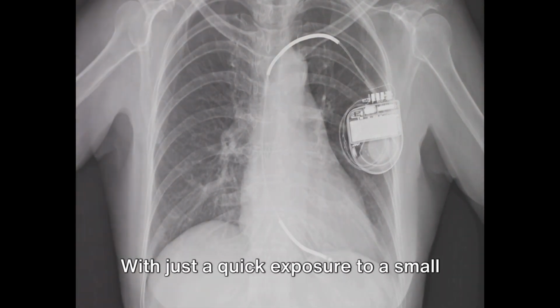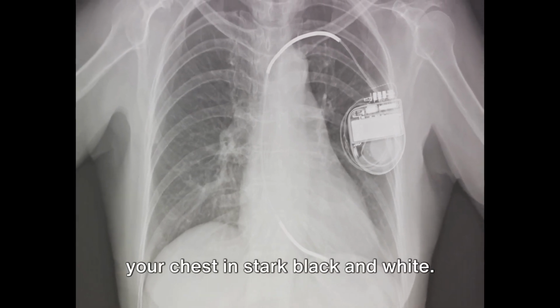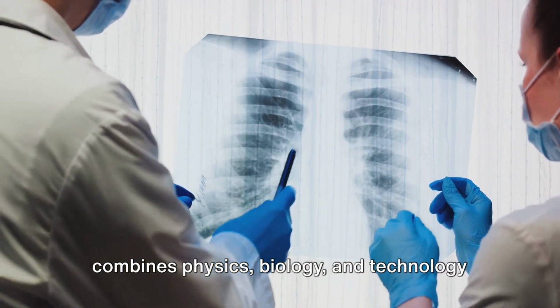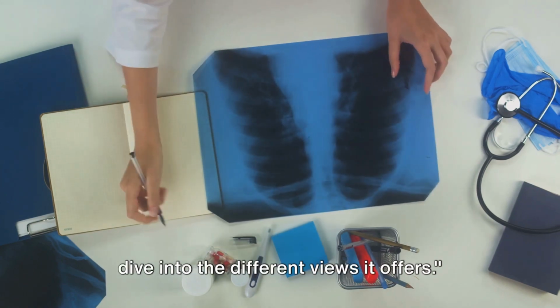With just a quick exposure to a small dose of ionizing radiation, we can produce images that reveal the structures within your chest in stark black and white. It's a fascinating process, one that combines physics, biology, and technology to help keep us healthy. Now that you know what a CXR is, let's dive into the different views it offers.